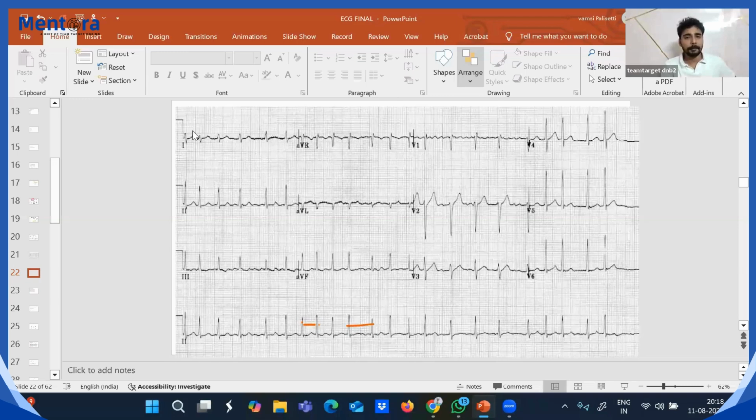Next, identify the ECG. Go stepwise, don't hurry, don't jump. First thing, narrow complex or wide complex? Narrow complex. Sir, did you put a new ECG? Yeah, I put the ECG. Able to see or not? No, the screen is in the old one only. Still the previous ECG. Yes sir, this is previous only, right, sir?